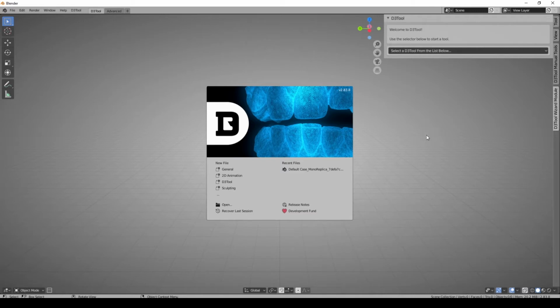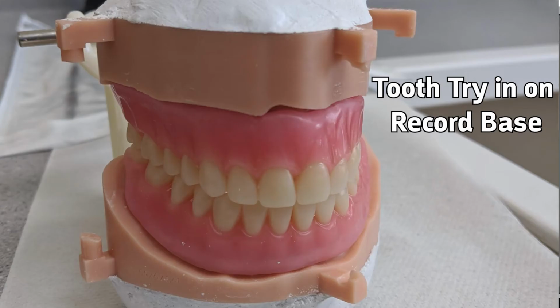A monolithic replica is a term we have coined for a removable denture that has an exact duplicate of a prior or existing denture, yet a brand new base from a wash impression from that same prior or existing denture. In effect, digitally rebasing a denture.